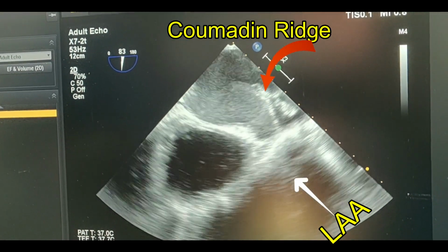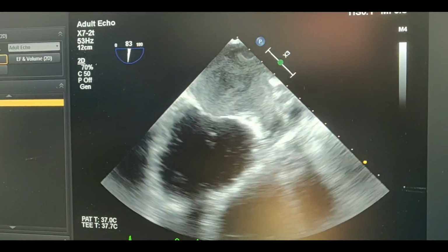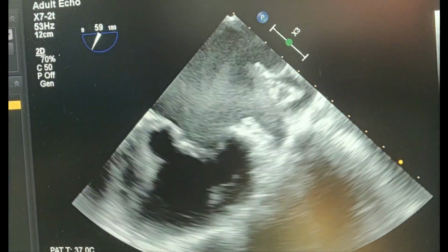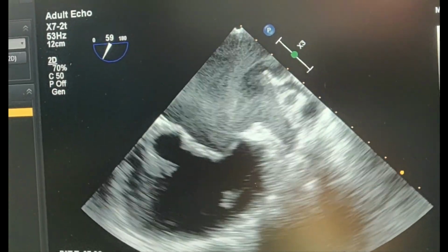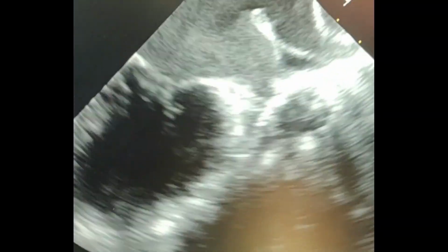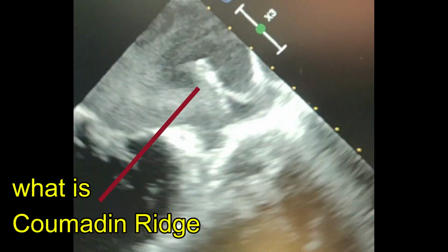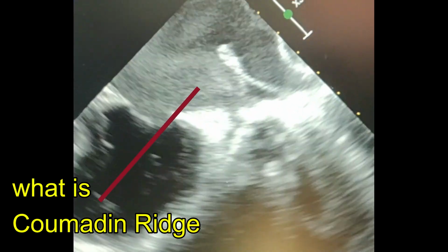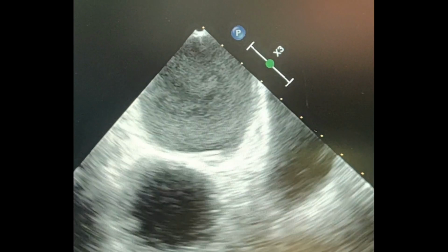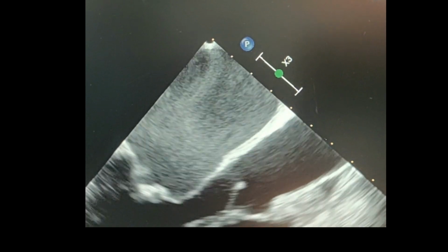So one of the predisposing factors for LASEC is low velocity, stasis, irrespective of the rhythm, either in normal sinus rhythm. If the LV function is very poor, you still can see LASEC, and in atrial fibrillation, you tend to see this aggregation of red cellular components in association with fibrinogen, because in these patients with severe MS, there is increased fibrinogen, which tends to bind with negatively charged red cells, and that's what the literature says is the cause for this ultrasonic reflection of blood seen as swirling of blood or left atrial spontaneous echocontrast.